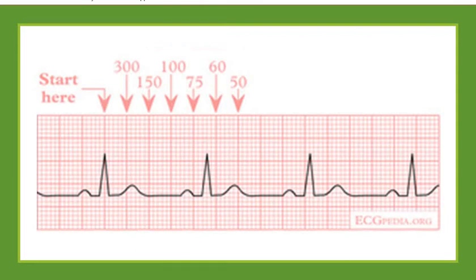You may have noticed that paramedics sometimes look at a printout and we're able to establish the rate just by looking at the printout without looking at the monitor. The reason for that is because in paramedic school we were taught to memorize the numbers at the top of the screen.